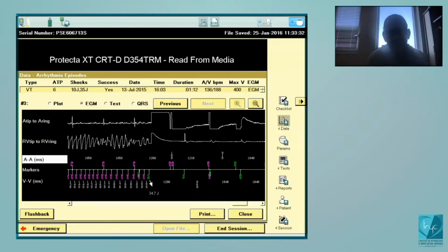In this patient, for example, he only demonstrated episodes of stable ventricular tachycardia that were not life-threatening, but we had programmed a low amplitude shock, and we can of course discuss the opportunity to program this kind of amplitude. But from this, you induce ventricular arrhythmia.